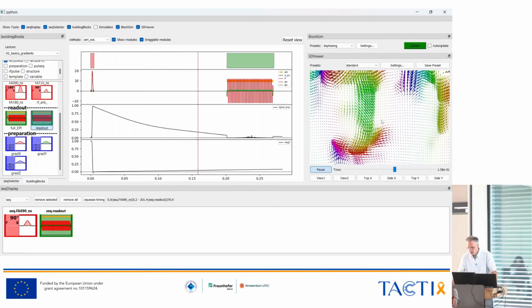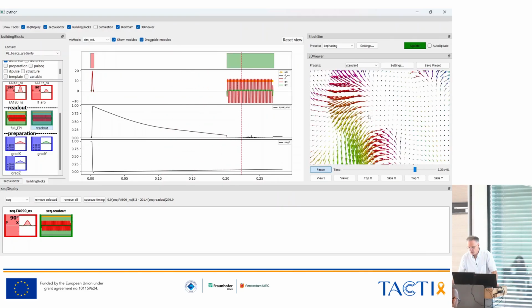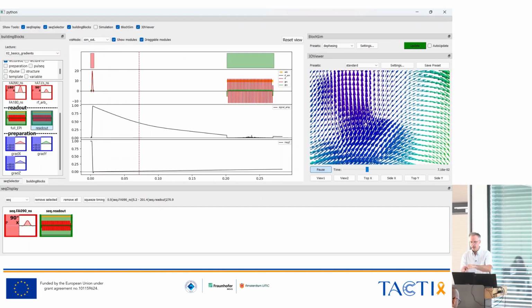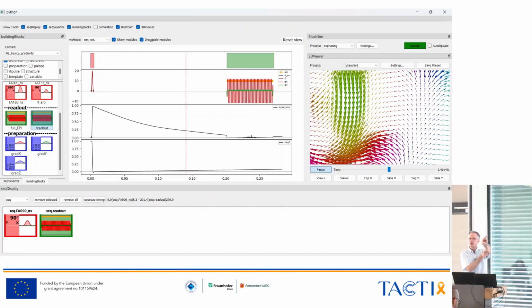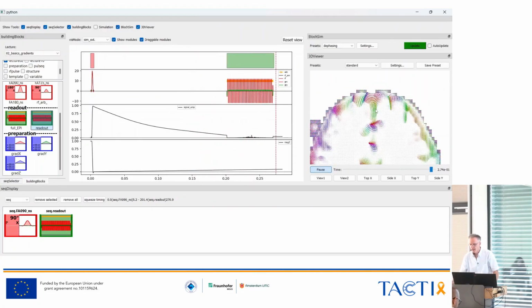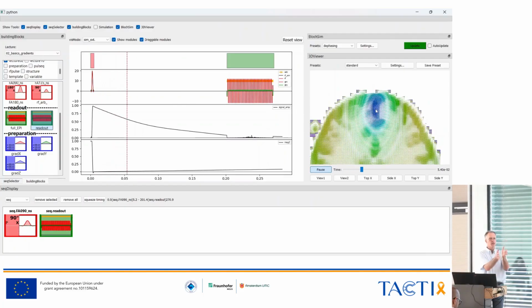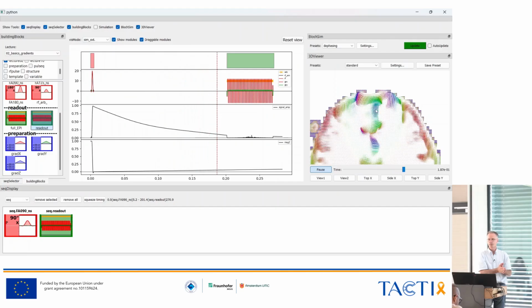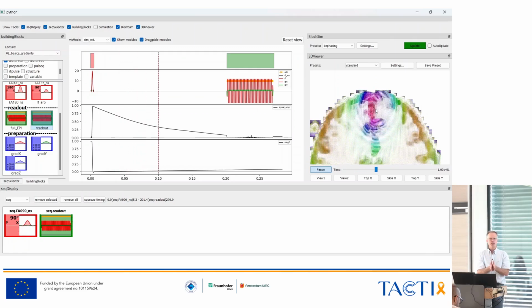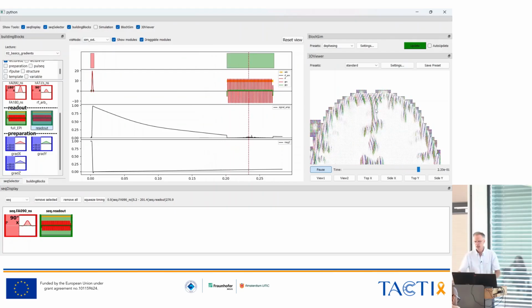There you can see, if you zoom in, that our magnetization, now we are applying the phase, but you can already see that the phase is changing more rapidly in those regions. And that means that we are experiencing signal loss in those regions more quickly. That's a problem, because in those regions we do have a dephasing of our signal, which ruins our signal.